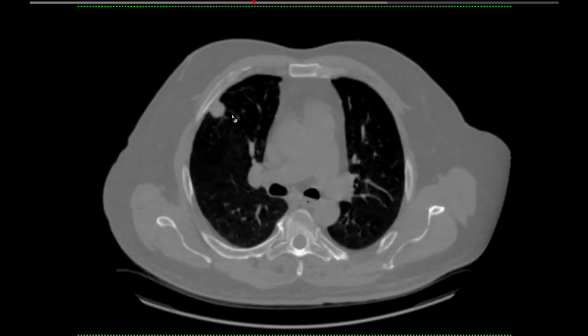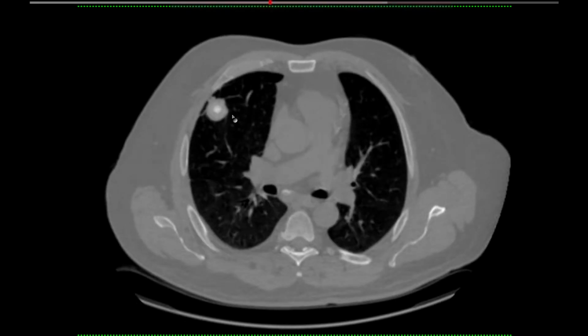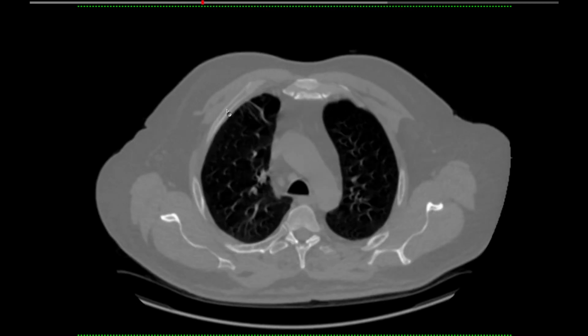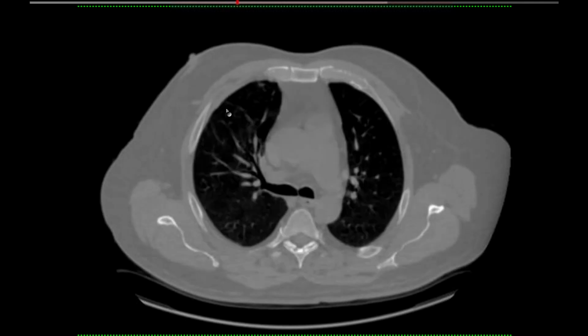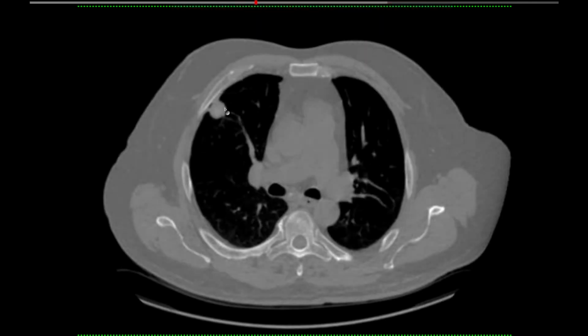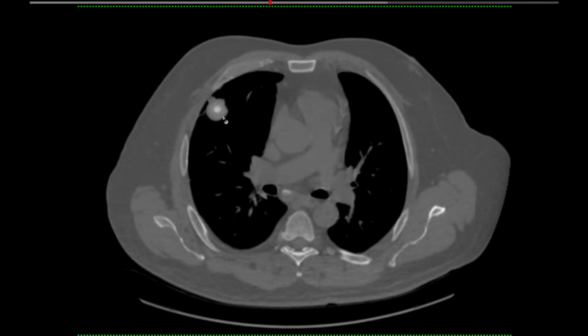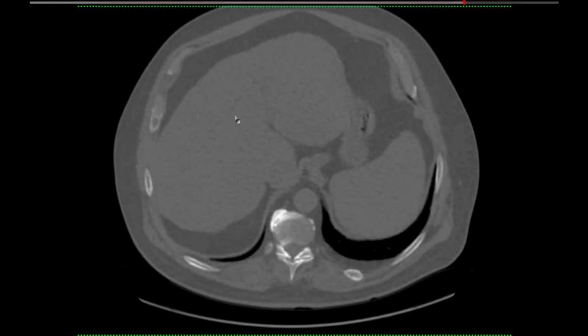He had actually a couple of big ones. This one, he's got this really nice one here in the middle lobe, and I'll window it for you. But you can see that target-like calcification and then the rim of soft tissue around it. And then he's got another one down here, kind of the same pattern. If you window it tightly or dark, you can see right there that ring of calcification. So this guy had a bunch of histoplasmomas. I've seen tons of little calcified nodules all the time, but I've never seen nodules this big. They went back over multiple years, and they do grow.